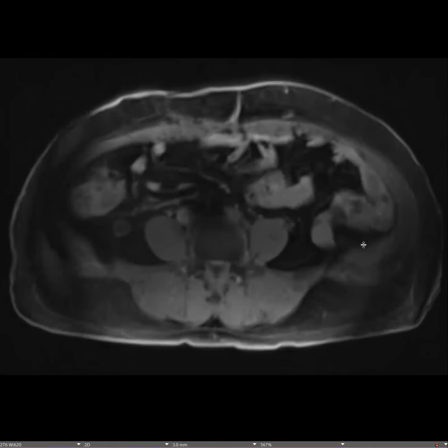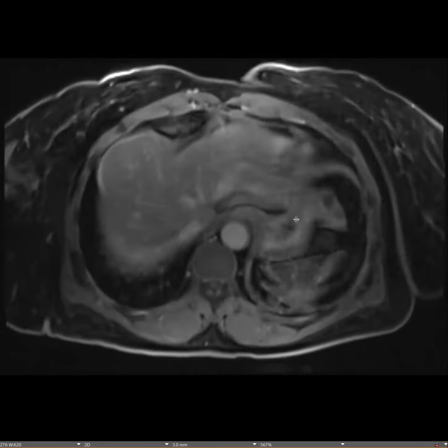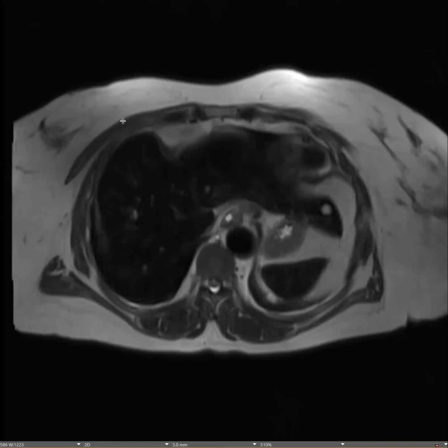And these cystic lesions are increasing in size over time, very slowly, but they are increasing in size. All of them were non-enhancing, cystic appearing. And he also had one in the esophageal wall as well.